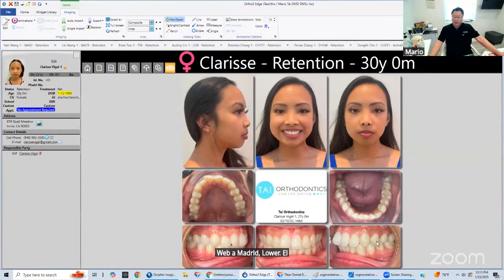And so I looked, and what I did is I said to myself, do I want to move all the teeth, or do I only want to move some of her teeth? So especially for adults, we gotta identify what, like I said before, what to do, what not to do. So in this case, she has great occlusion. Her posterior occlusion, both sides are wonderful. If you look at her arch tooth by tooth, at her lower arch, at the back, the second molars are lingually tipped. Look at the top and then the bottom again, and she has her third molars.